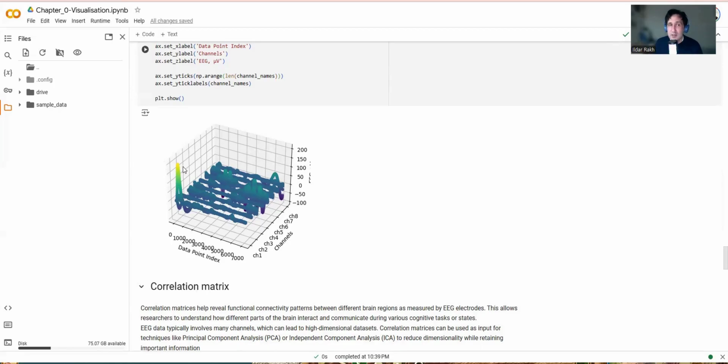It's not EEG data, it's quite high amplitude. The best way is probably to just remove it, because it's about 250 samples, about 1 second of recording. We can remove this data from all channels, or think about how to implement some signal processing if necessary, if some channels have important information in this part, or probably the first channel also has.